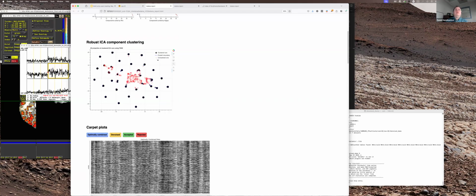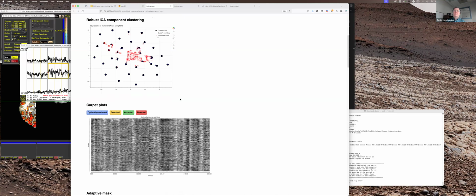But there are some clusters that did not cluster well. Every one of these clusters became one of the components across the iterations, and they'll be much more stable, but it gives you a sense of what it looks like. If you're seeing wider clusters and circles that cover a lot more, the reds are the ones that didn't end up in a cluster for an iteration. If they look weird, that's something else to think about.